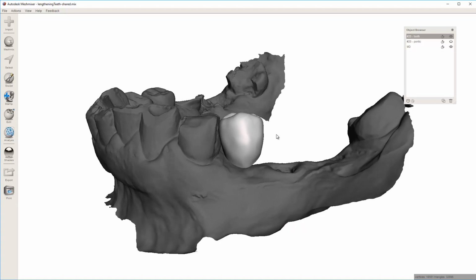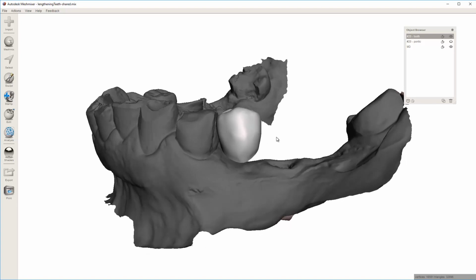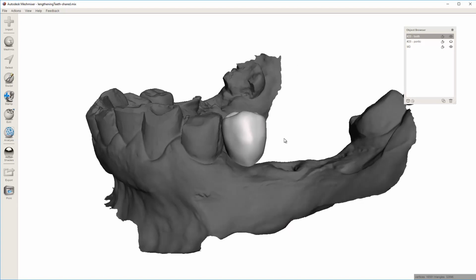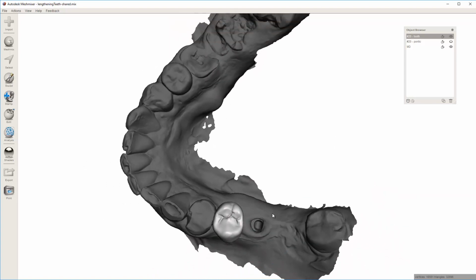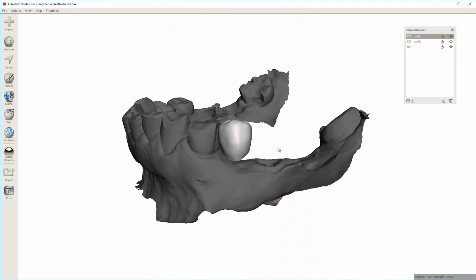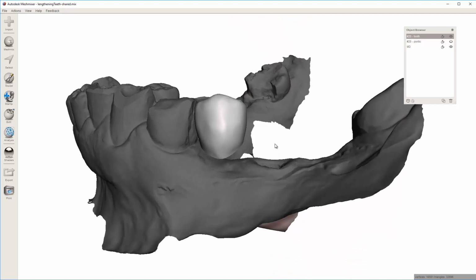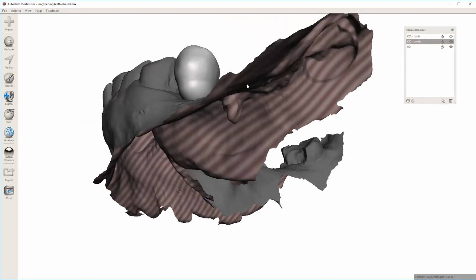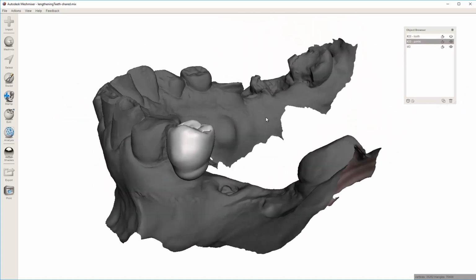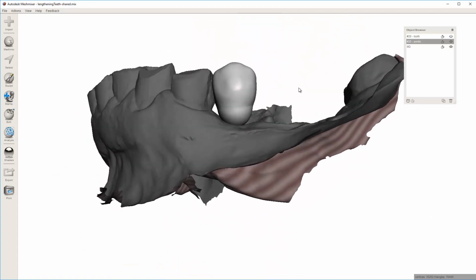And so there was discussion about some of the different ways that you can correct this. I'm not going to go into all those ways, because those are covered in other videos. But here's how I would do this. Now, two things. First of all, if you were to bring in a pontic tooth instead, that's certainly going to make things easier because it's already a closed tooth. But honestly, not all the pontics are closed the way I want them to be.